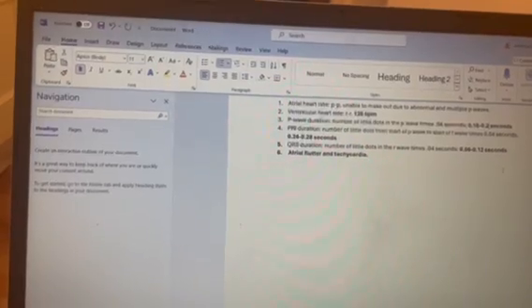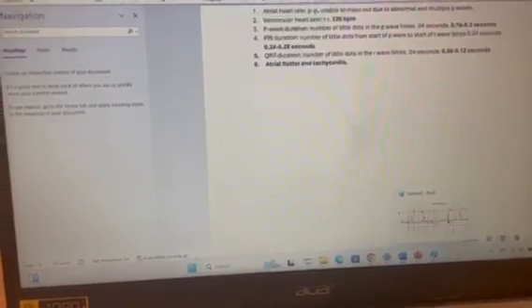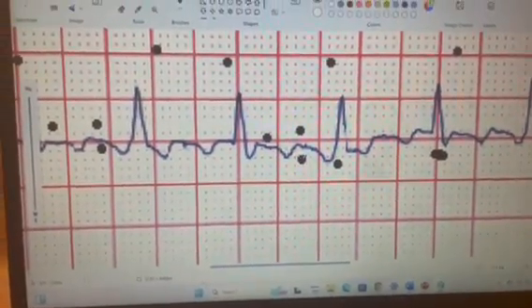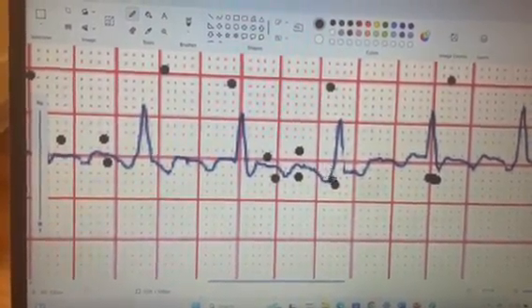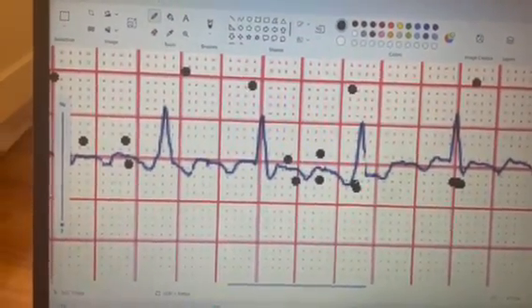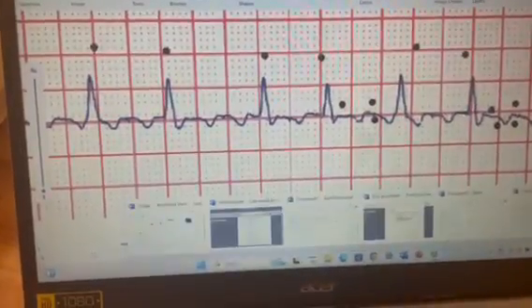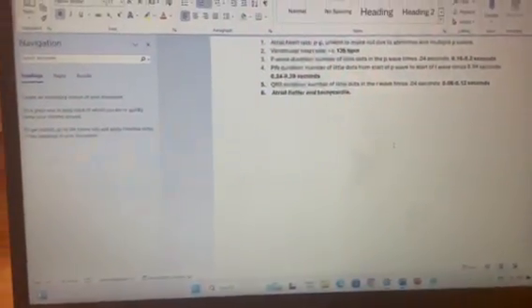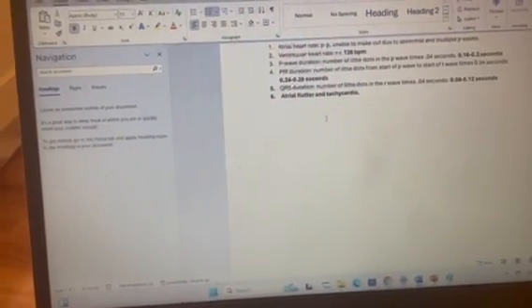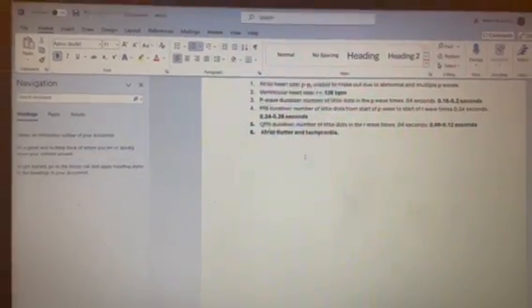What we can see from this is that we already established tachycardia. And because there are commonly 2 atrial waves before each R wave, 2 P waves before each R wave, 2 for 1, that's not supposed to happen. It's supposed to be 1 P wave and 1 R wave. When there are 2 P waves, we call that atrial flutter, and that is what I put over here. Because of that and the higher than average heart rate, I would say that this person, case 35, has atrial flutter and tachycardia.